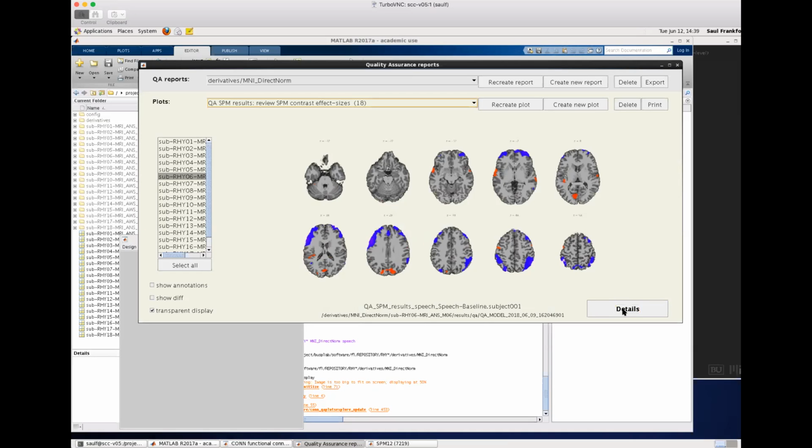Okay, and might you see this to a lesser extent around the ventricles sometimes? Like not really a signal in the ventricles, but then you moved a little bit and it's like, oh my gosh, there's a lot of signal, but just to a lesser extent? Sorry, I didn't catch that portion of the phrase. Could you repeat it, please? Do you sometimes see this to a lesser extent around the ventricles?